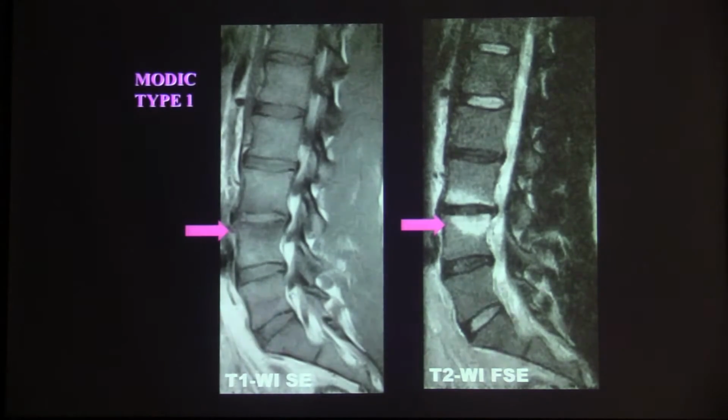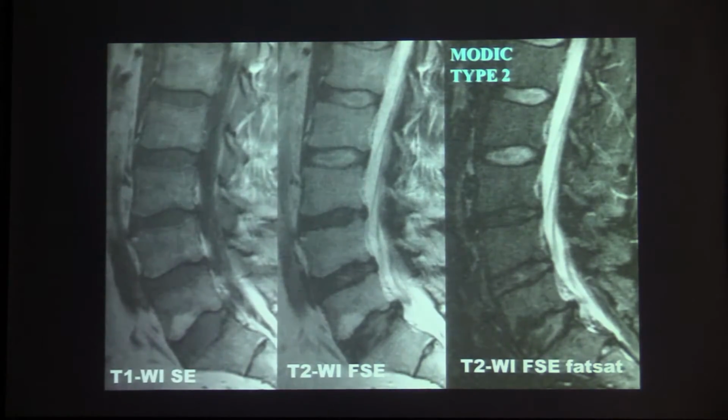But this is associated with degenerative disc disease, and when it's this size, typically greater than 50% of the AP dimension and one third of the craniocaudal dimension, these are associated with pain in several different studies using discography. So that's our Modic 1.